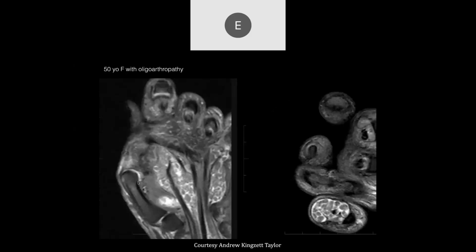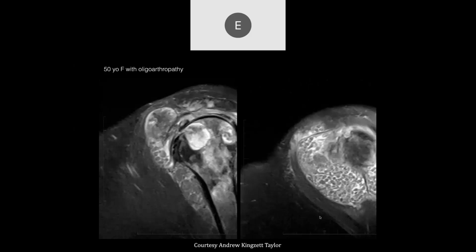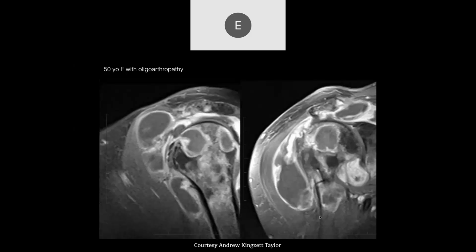Yeah, I would think about the MR synovial fluid with these little rice bodies. Think about TB. Yeah, lots of rice bodies in the glenohumeral joint, and these huge abscesses, big erosions in the bones, multiple joints are involved. This is TB.